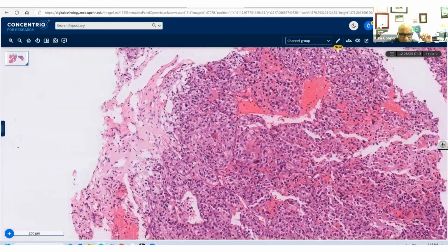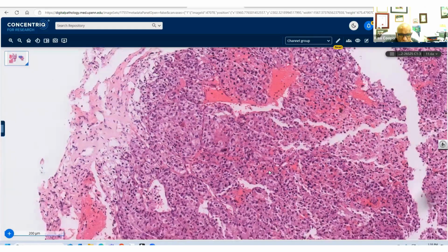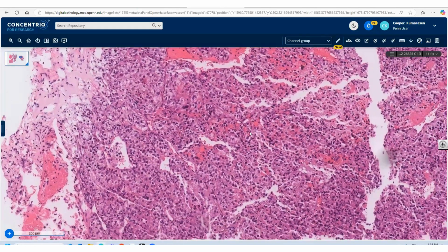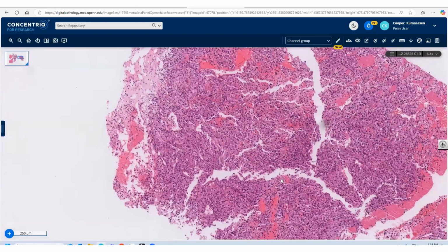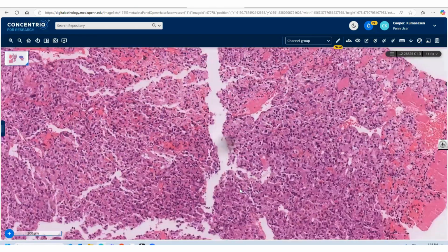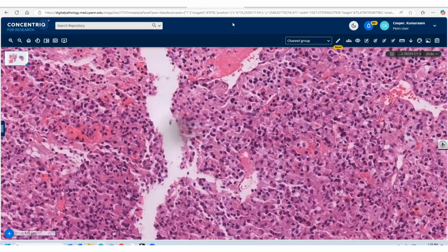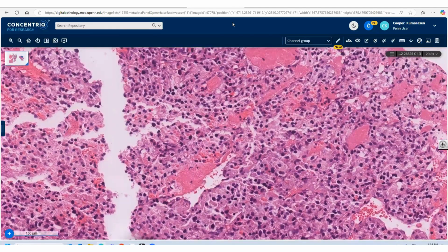You wonder about a metastasis. How old is this person? This person is 28, female. Okay, so probably less likely. I still think it's probably pituitary, but I guess you have to rule out melanoma and weird things or a renal cell type situation.